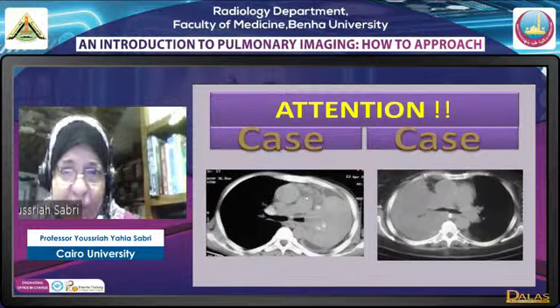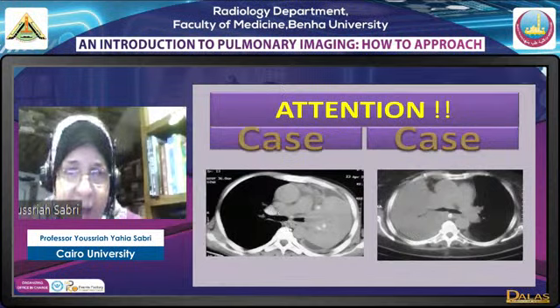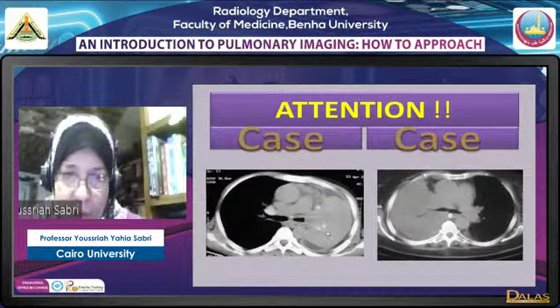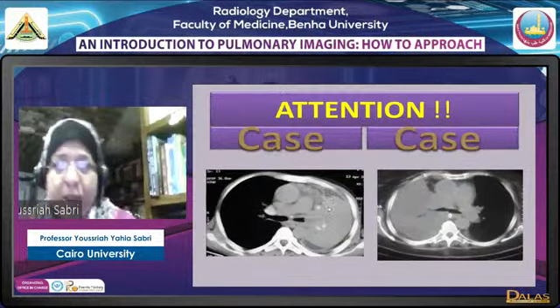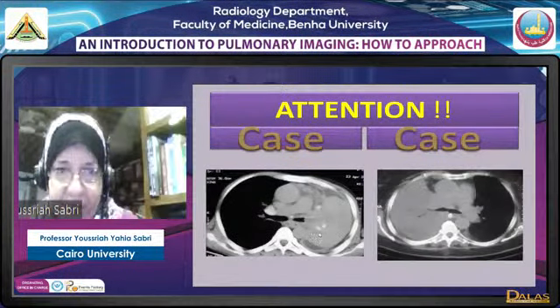In both of them, we don't have a mediastinal shift. On the right side here, we have air bronchogram, and this is consolidation. On the left side, however, we have an endobronchial lesion. We have no air bronchogram whatsoever, and we have collapse and effusion, and this is absorptive collapse and effusion, obstructive collapse and effusion. These are to be differentiated.